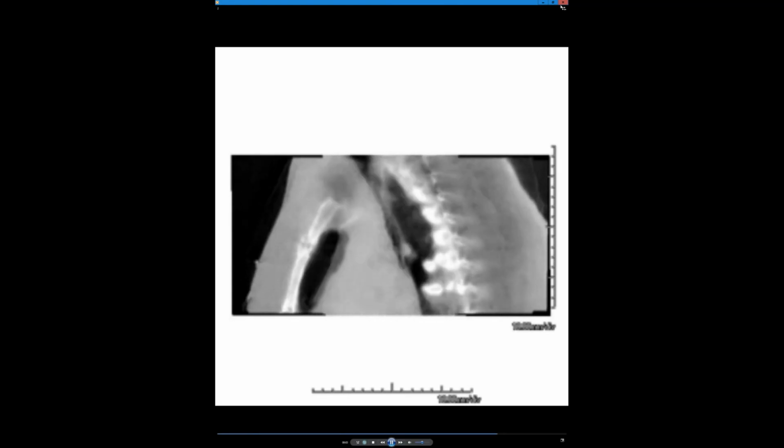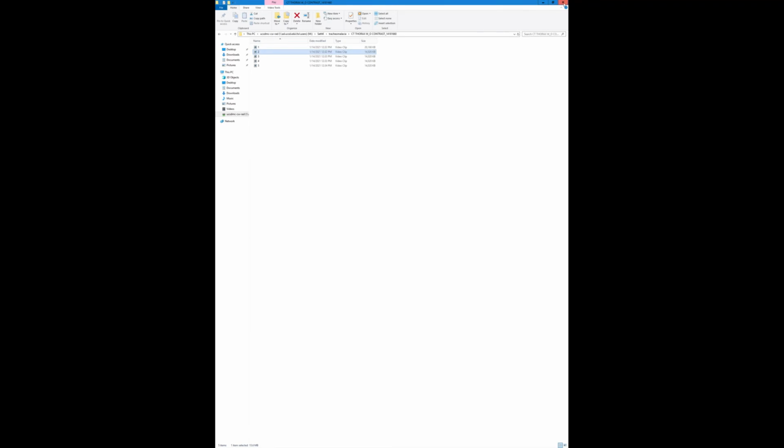So you were talking about the dynamic tracheomalacia protocol. This is a guy with tracheomalacia where we're doing kind of dynamic imaging with the Revo, doing dynamic coughing with repeated rotations. And that's a positive case, clearly. That's pretty cool. And you can do it at any level.